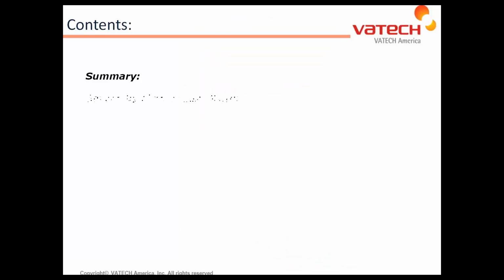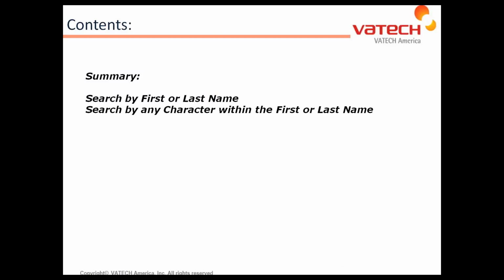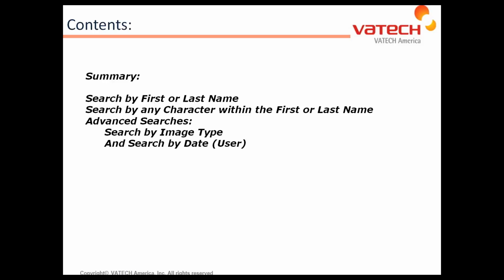In summary, you should now be able to perform a search either by first name or last name, search by any character within the first or last name, as well as perform an advanced search either by image type or by date and by user.